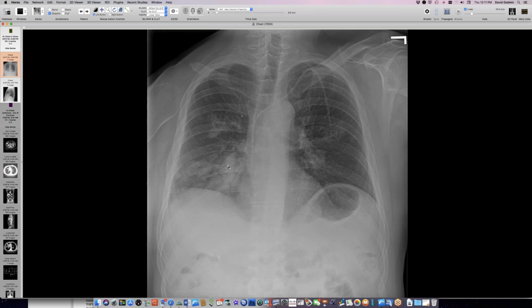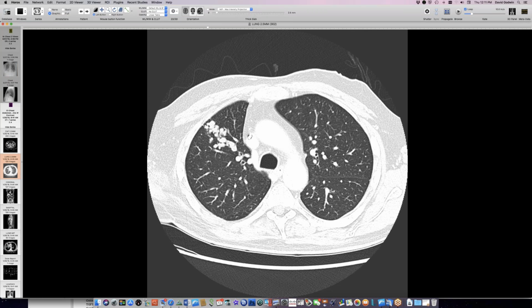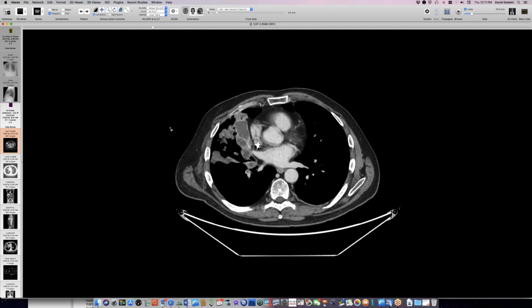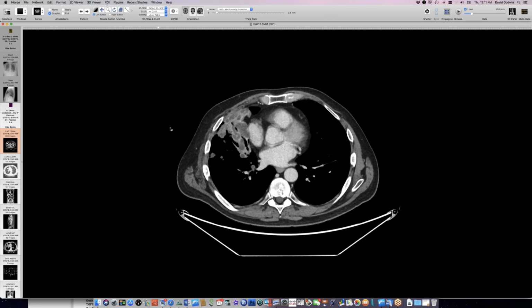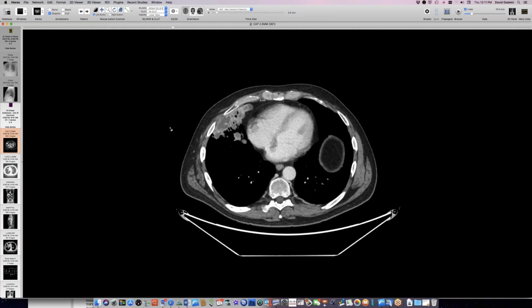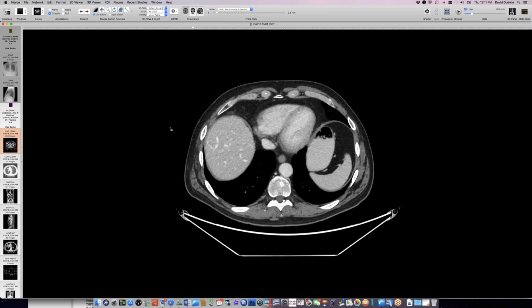Last month, on this guy with all these lung metastases, some of them have an interesting shape, and that shape comes out nicely here, I think, with CT. Let me show you the standard soft tissue window, and you can see that these are really end arterial, sorry, intravascular, really intra-arterial metastases that have grown along these arteries.